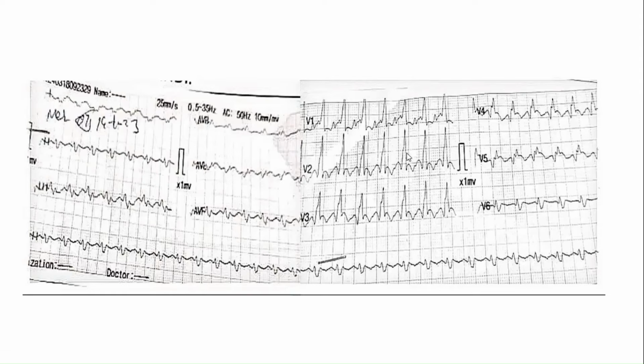In any patient who has ischemic cardiomyopathy with EF 25 and this heart rate, sinus tachycardia is very unlikely. Why would he have sinus tachycardia at such a fast rate, 160, 170, with such a bad conduction system? He's having these broad QRS complexes, so this doesn't look like a sinus tachycardia. So what else? Obviously you have to rule out VT.